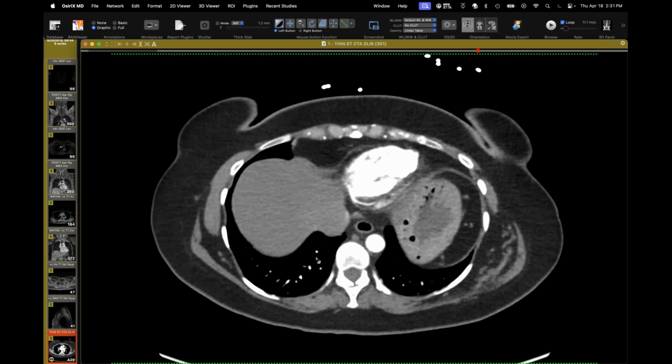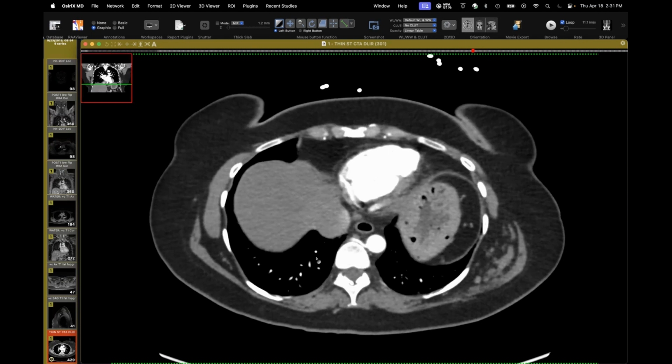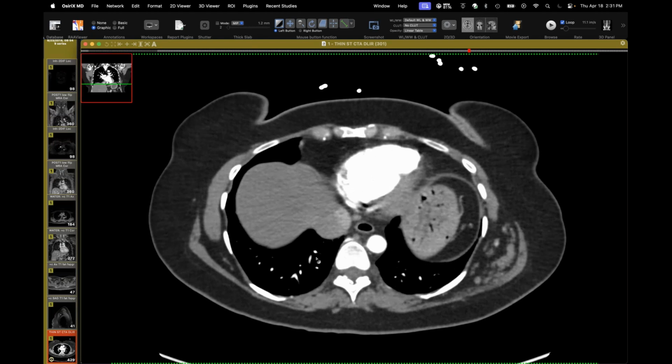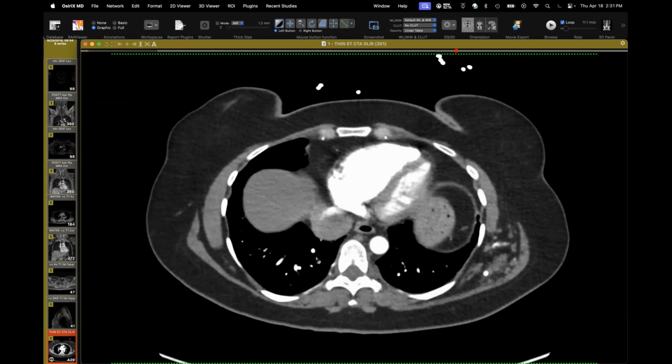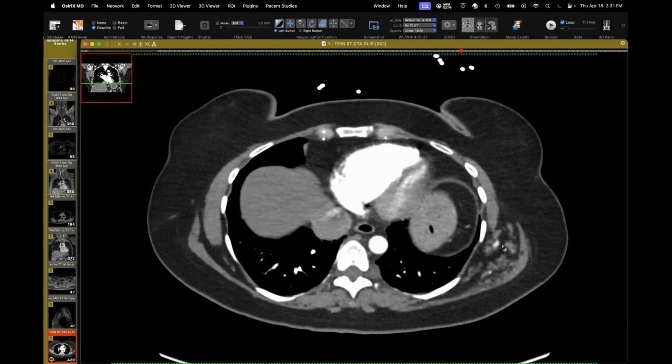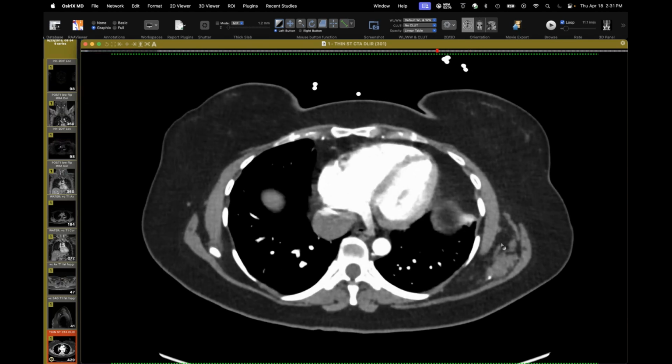This had been previously diagnosed. We just had to get some older imaging to look at this, but if it's not doing anything, it's a don't-touch lesion. So a slow flow vascular malformation characterized by fat, vascular channels, and phleboliths, not an elastofibroma dorsi.